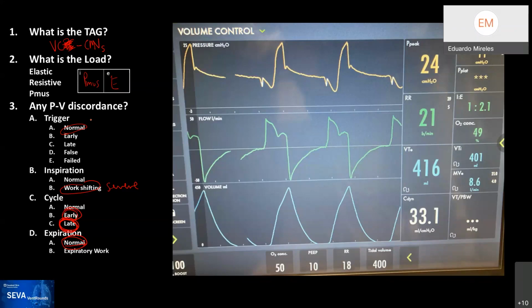All right, so let's talk about this. Lots of good comments, and so you have up here volume control. What we know, and this is the experience that you guys now are gated because you know that many times it says volume control and it's not volume control. So you have to try to read through the waveforms and get an idea of it. If this was volume control, and a descending ramp, you would expect to see something more geometrical, right?